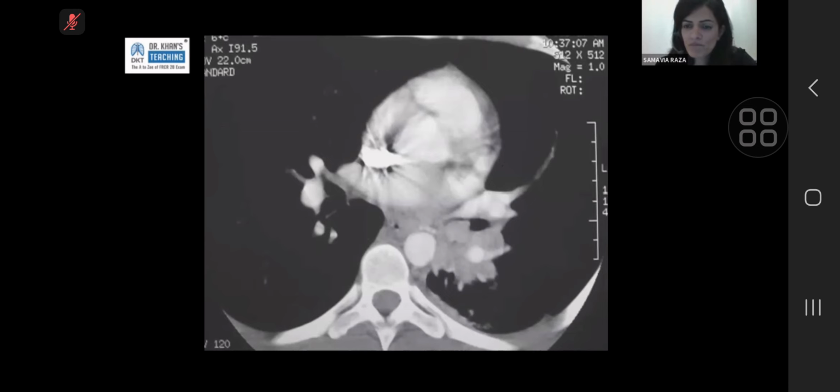Exactly. You would have expected it to fill the bronchus first before extending outwards. This is indeed a lung mass extending into the bronchus. And somebody said esophageal tumor. Yeah, good differential. Depends on who's teaching you in which session this is. But yes, this is a differential. But if it was esophageal, you would expect it to radiate from there rather than go along it and extend there. The metastatic involvement I wanted you guys to pick was the pleural involvement and the pleural thickening.